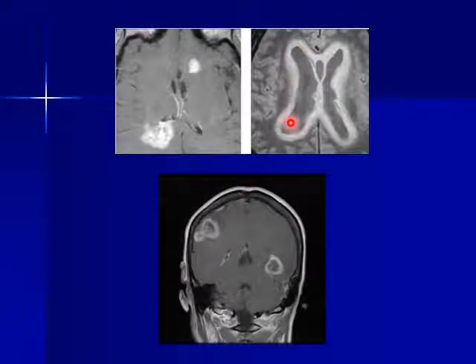like this. The other thing is that glioblastoma multiforme can present as multicentric, like this, simulating metastasis, and this is a dilemma. You can see multiple lesions at the same time or one after the other, representing multicentric glioblastoma multiforme.